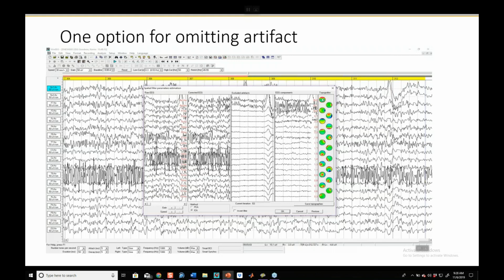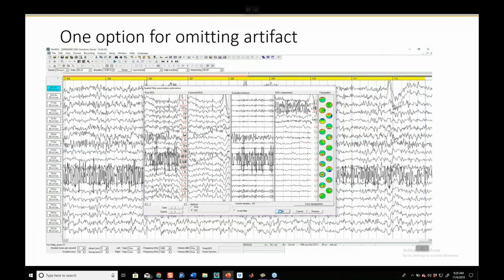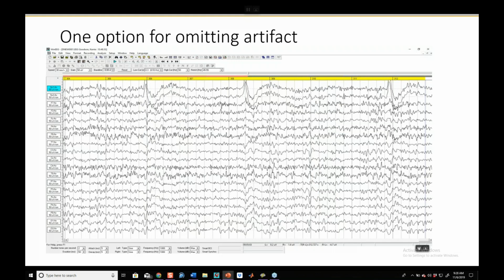And when I find him, and in this case he's the second and the third component, you see head number 2 and head number 3. The red dot and the blue dot signify two different dipoles of the same phenomenon. So what I've done here is I've removed that piece of data from the EEG, and I've cleaned it. And there's an argument in the field as to whether or not this ruins data by altering phase and field. And you know, it alters data for sure, but I think it alters it for the better, because now we can see what's happening outside of that artifact.